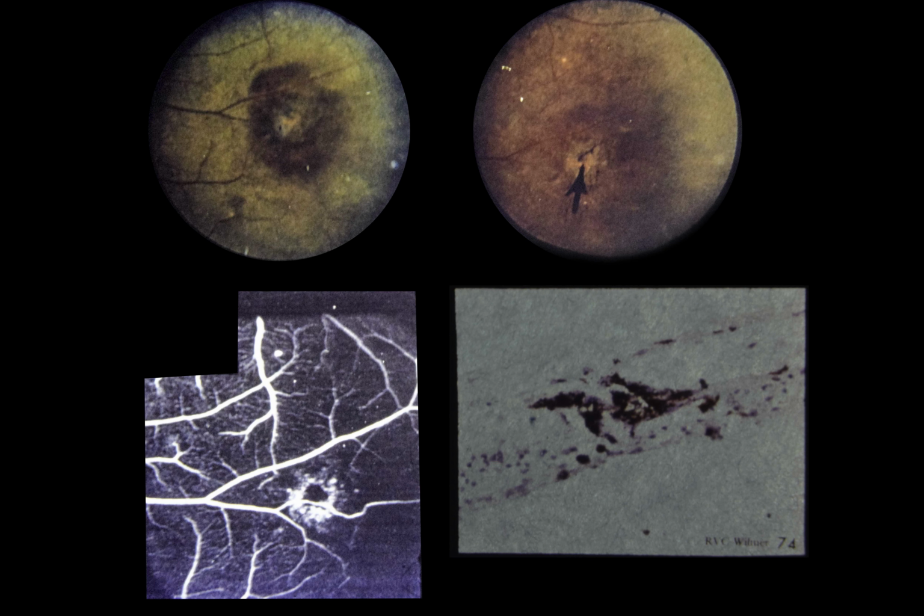The final ophthalmoscopic appearance depends in part upon whether the original hemorrhage was located predominantly beneath internal limiting membrane, within retina, or beneath retina. Upper left, note intraretinal and deep retinal hemorrhage in a 44-year-old black male with hemoglobin SS. Upper right photograph, taken 1 year later, shows most of the hemorrhage had reabsorbed, leaving an area of atrophic pigment epithelium and retinal atrophy. Note marked attenuation of retinal arteriole passing through the center of the lesion.